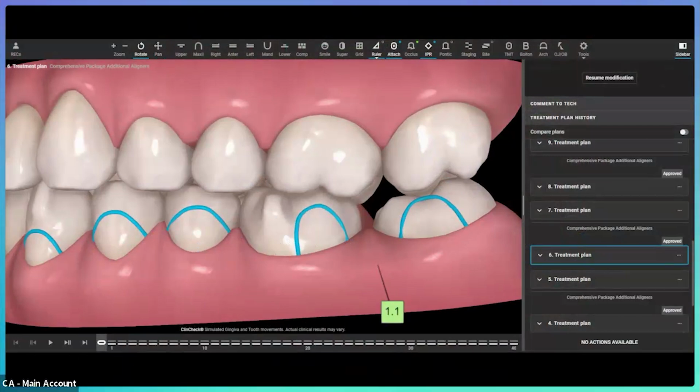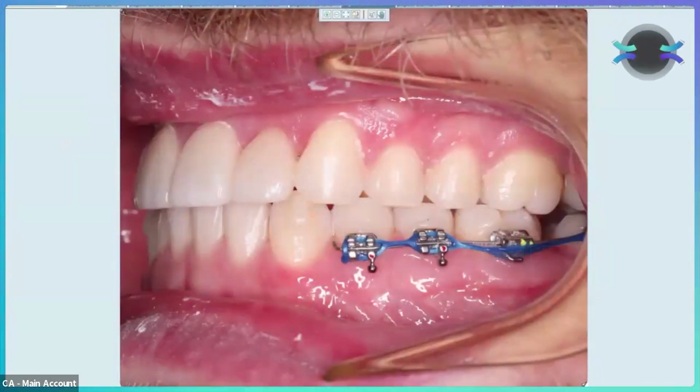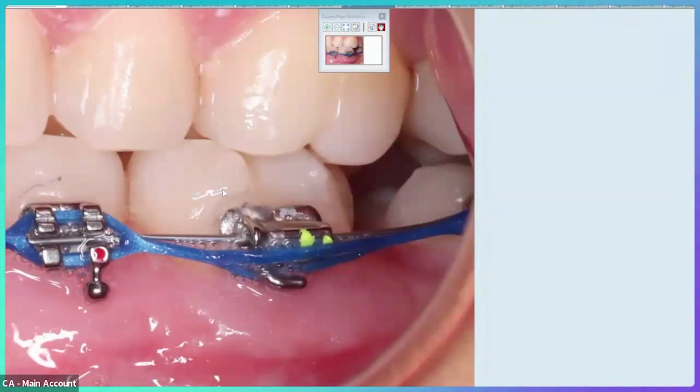Now it might be that the wire gets hit by the aligner. And so if the aligner is actually hitting the wire, we may need to take some crown and bridge scissors and cut right here below this attachment. And what you'll actually see on his plan, notice how I trimmed the attachment down because the bracket would hit the attachment. Let me zoom in on that, right here. On the 6, the first molar, we trim this attachment down to be slightly less high, and the bracket goes underneath that.